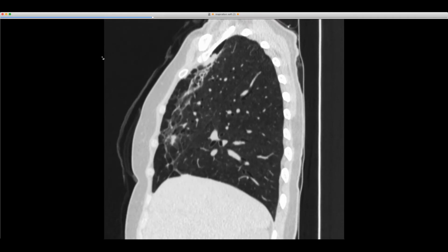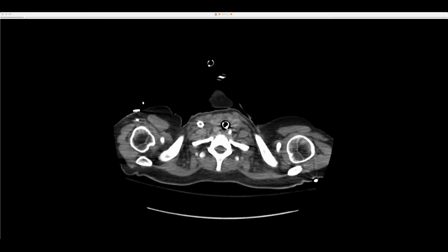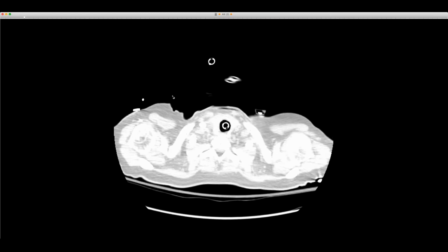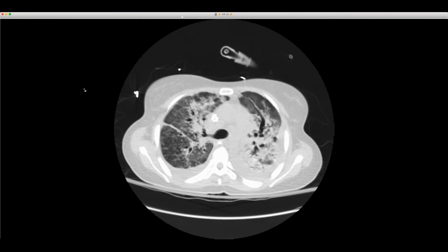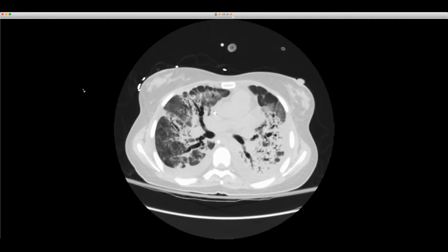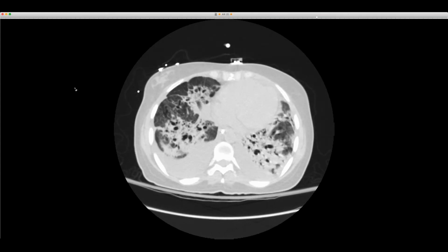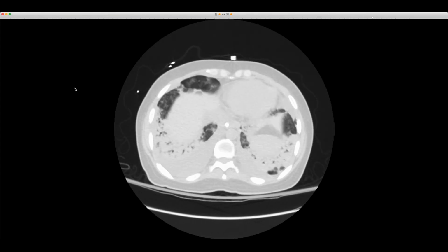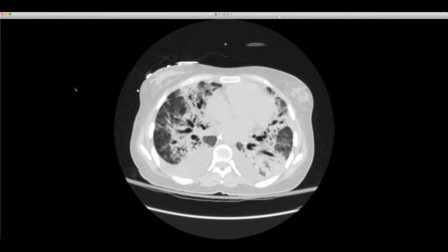And so, the history was withheld, but she had come in with about 2 weeks of... let me flip to the prior CT. This CT was 3 months prior to that CT. Let me show the screen here. And she looked like this. Switch to lung windows. The history here is, this is a patient in her 30s who had about a week of cough, went downhill, and tested positive for influenza A.